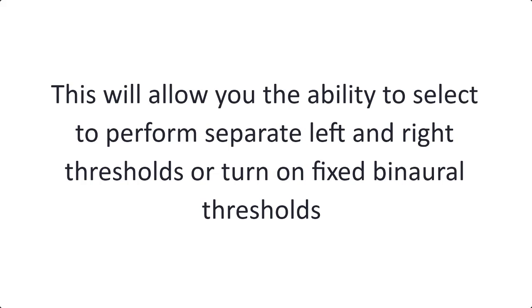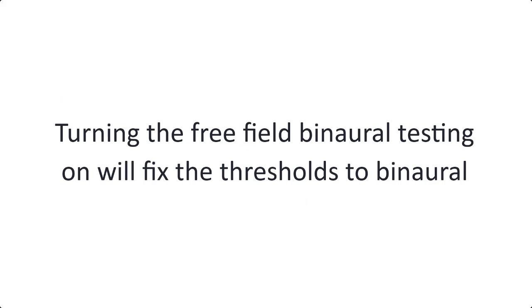This will allow you the ability to select to perform separate left and right thresholds or turn on fixed binaural thresholds. Turning the free field binaural testing on will fix the thresholds to binaural.